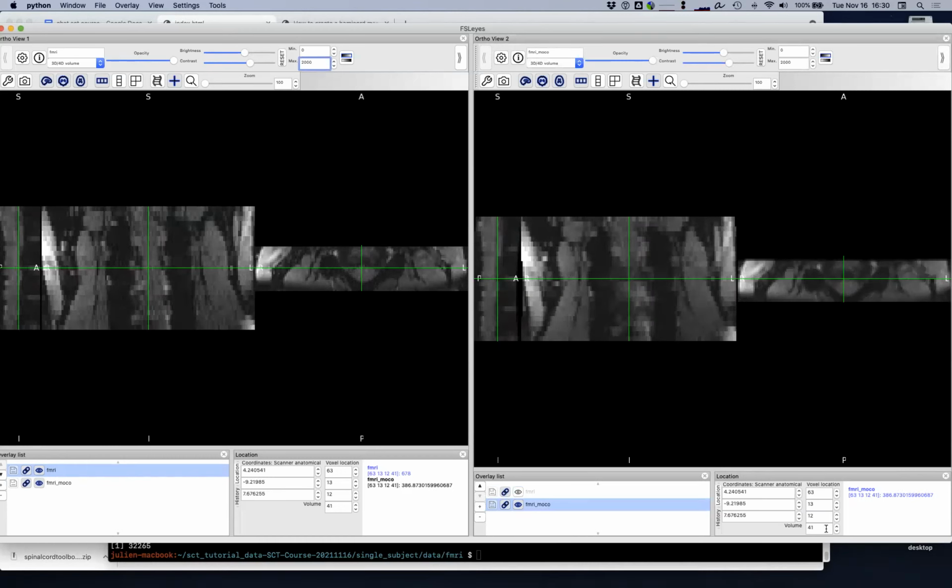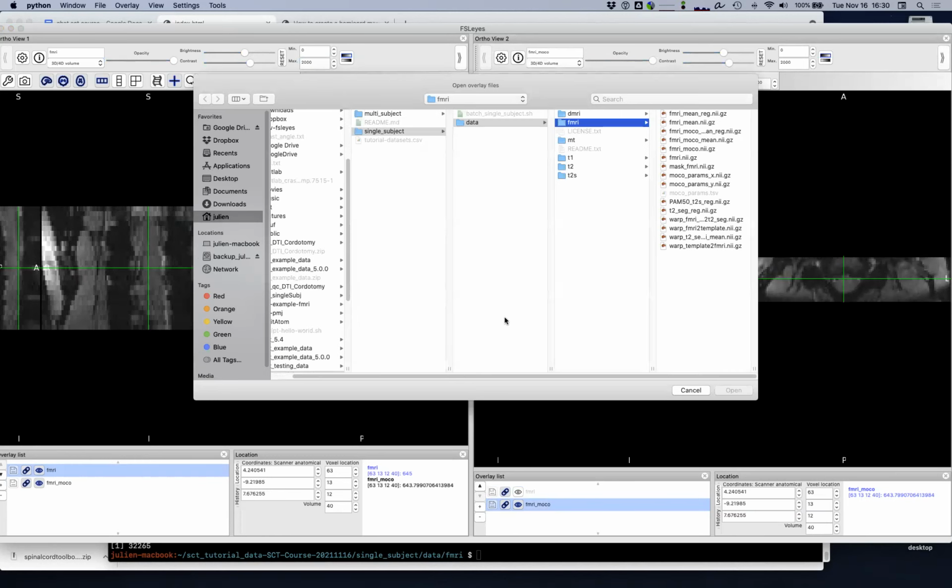What's interesting is that if you look at the sagittal view here, you can see that there is some sort of bending, right? So that's typical of the polynomial order 2 of the slicereg method. What's difficult is that if we overlay the mask, it will tell you a bit more about what the algorithm is trying to deal with.